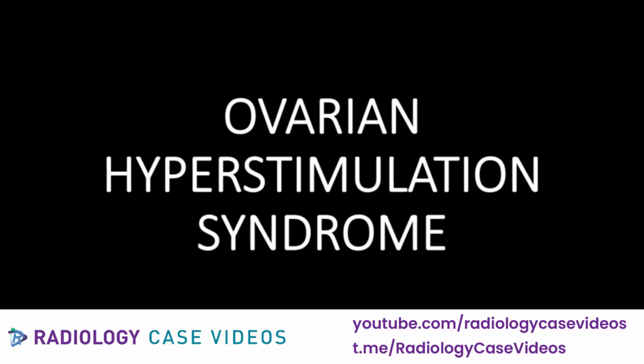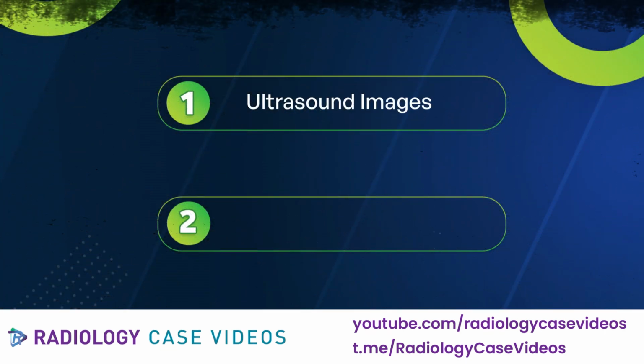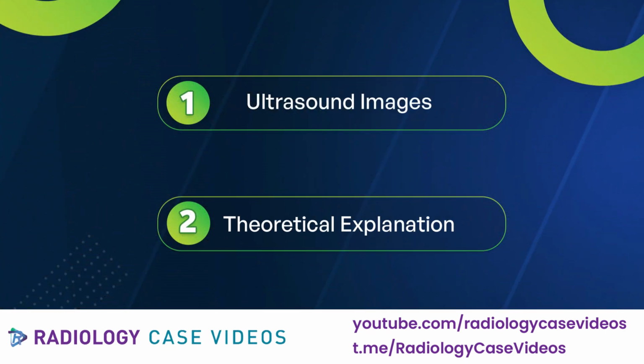Today we have an interesting case to discuss, which is that of Ovarian Hyperstimulation Syndrome. So we'll begin with a lineup of ultrasound images of the case, followed by a brief theoretical discussion.